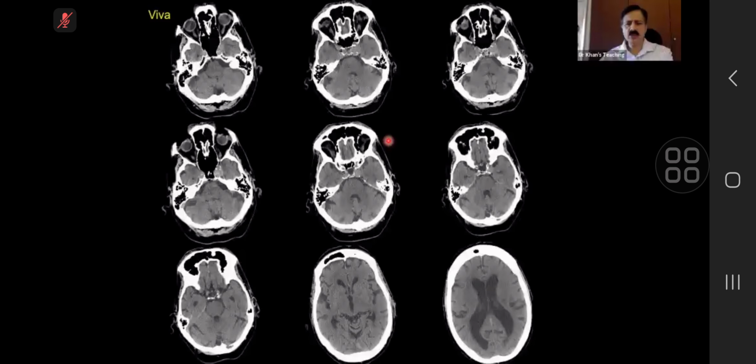Last time, if you remember, I showed you 4 or 5 cases of pituitary adenomas. And those pituitary adenomas, some of them were extending into the cavernous sinus or the sphenoid sinus, etc. The examiner is always going to show it to you on an axial sequence. And in the attention of the exam, you are looking at the whole of the brain, and actually the problem is here. Again, an edge of film type of a case for me. So if you see here, there was expansion, at least something is visible.